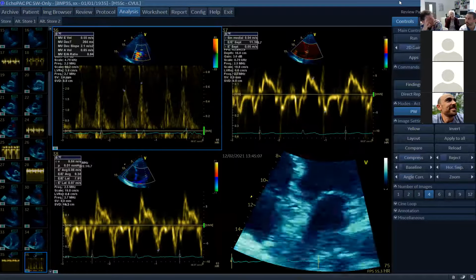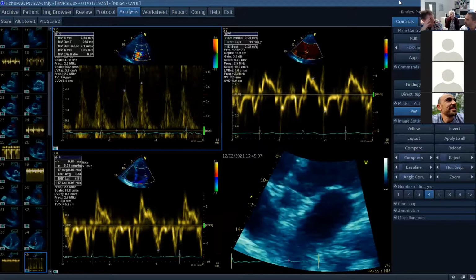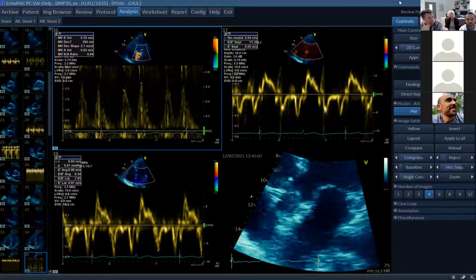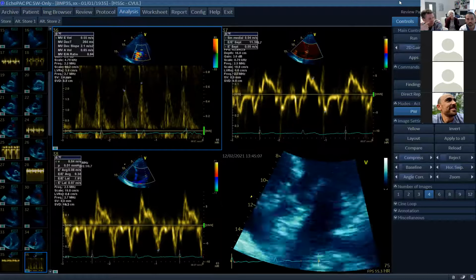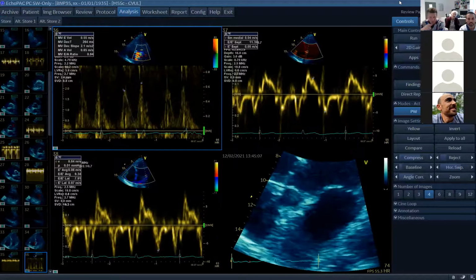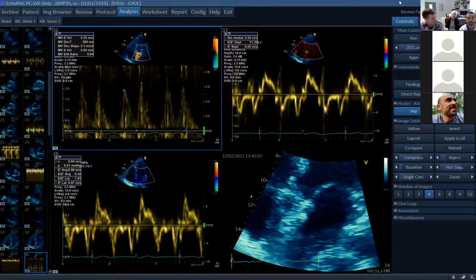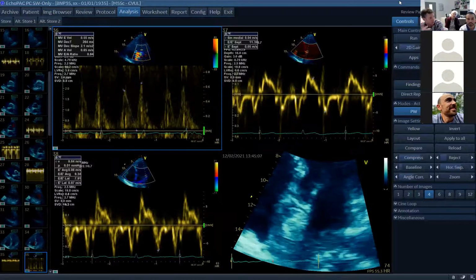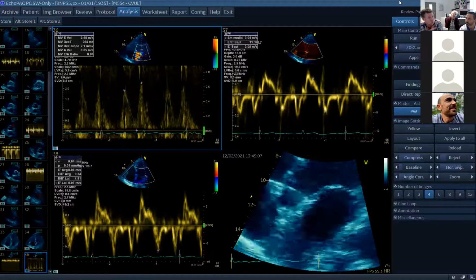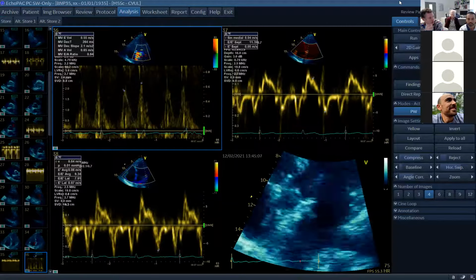You don't actually even have normal on the bottom one, because there's some form of diastolic dysfunction if you have any kind of structural abnormality or reduced LV systolic function. Anyone with hypertrophy, even that's a structural abnormality, or any kind of systolic dysfunction, will have some form of diastolic dysfunction. So you're definitely in grade 1. As you said, we've got mild diastolic dysfunction.